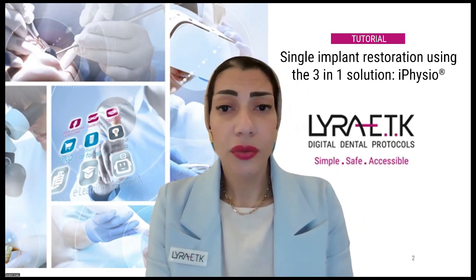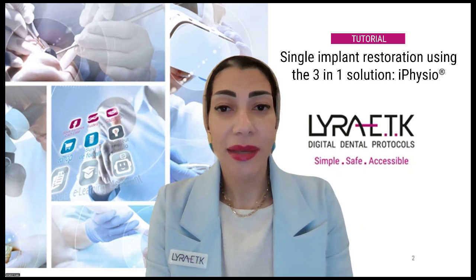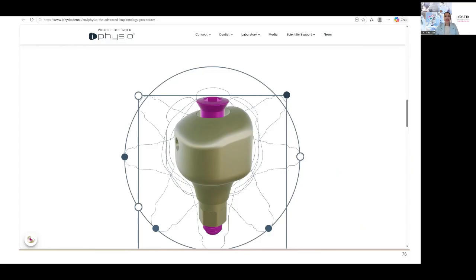In the previous video, we discussed how to design a single implant case using the LYRA ETK scan body. And today, I will demonstrate how to design a single implant case using the innovation of the iPhysio from LYRA ETK. In the beginning, I would like to give you a brief overview about the iPhysio.